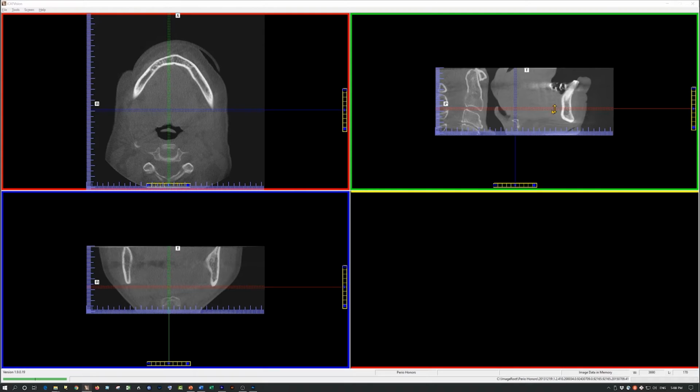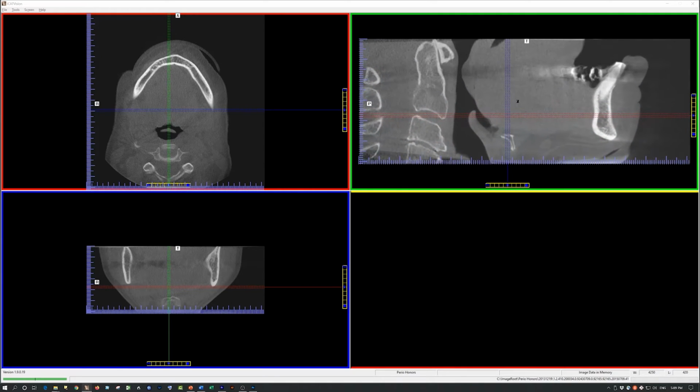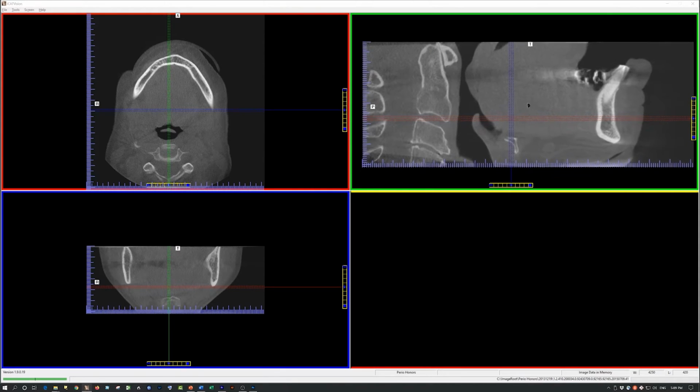At this time, let's review what our cursor does. As I had mentioned earlier, on the bottom of the screen, it's a W, or the density and contrast. This is the windowing. By holding the left mouse button, we can change the density and contrast. We learned that earlier. If we move the cursor towards the upper right, we see a magnifying glass or a zoom tool. You can make the image larger or smaller. I'll fill it up to use the available real estate. If you bring the cursor towards upper left, you see a positioning tool, and it changes the position of the image on the screen.